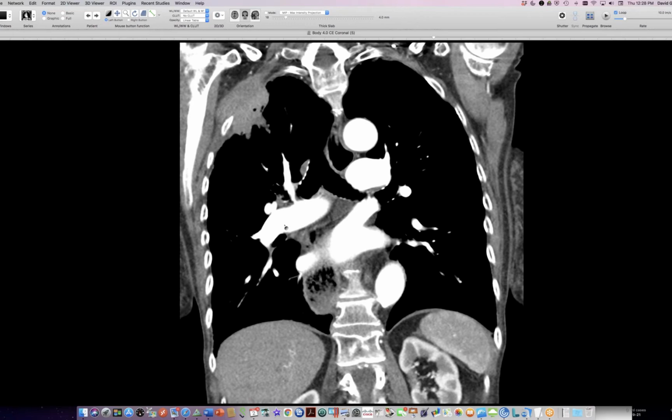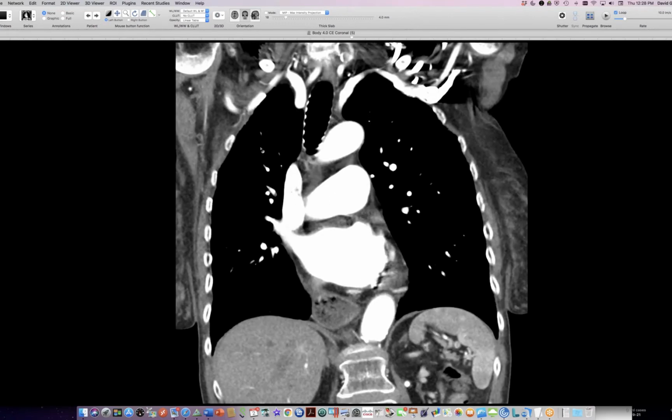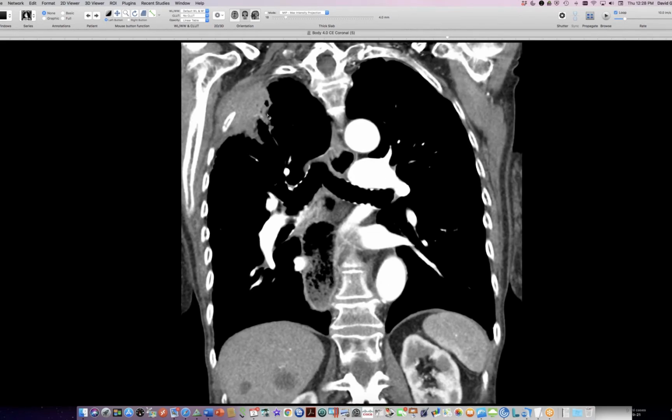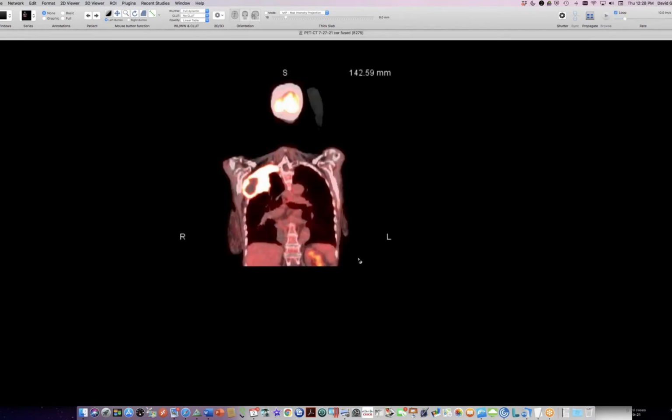Organisms that can do this include tuberculosis, nocardia, actinomyces are the famous ones. Other fungi are on the list for lesions that involve lung and spread into chest wall. So xenopi, and here's what it looked like on PET. It's a very hot lesion with a necrotic center.